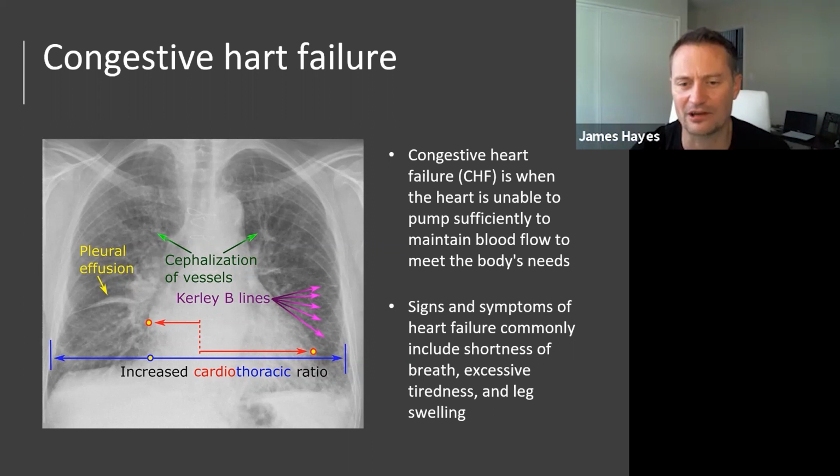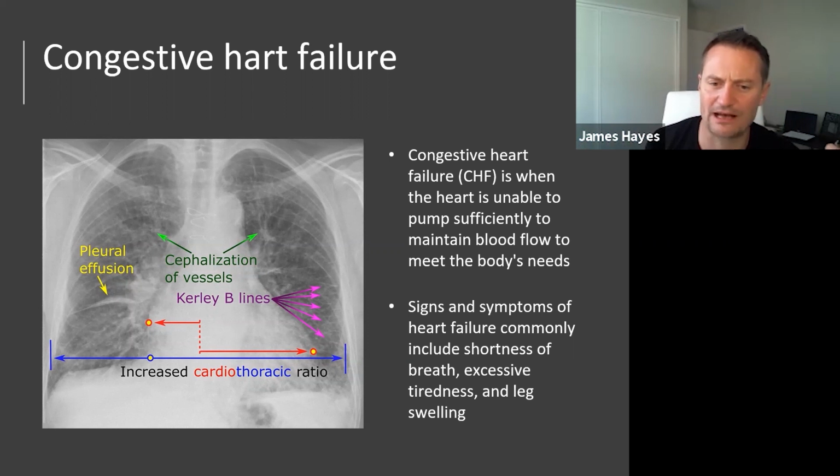But you know that they've had cardiac surgery because they've had their sternum wired back together. And you know that they're well enough that they could stand up, so they're not slumped in a chair. All right, so they've got a pleural effusion and they've got a bit of heart failure, whichever way you spell it. But they're generally quite well. Okay, so you want to know about the previous cardiac surgery because that might make you look up their cardiology notes just before the patient arrives. And so this is why radiographs often have more clues on them than exactly what you're looking for.